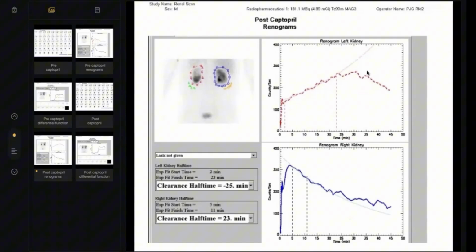This is a case of renal artery stenosis. Where in this kidney? Which one? Here. This is prone position. So this is left renal artery stenosis. What happened here, my colleague? Thank you, doctor, really so much.